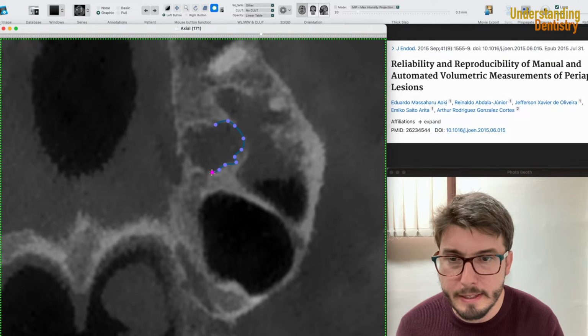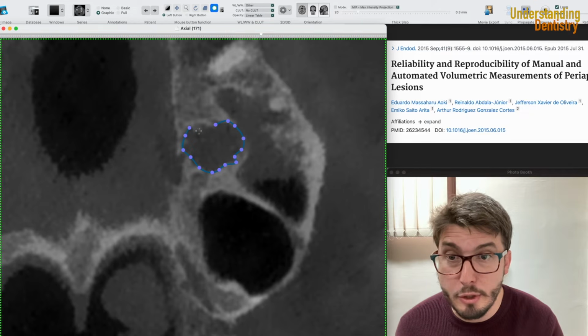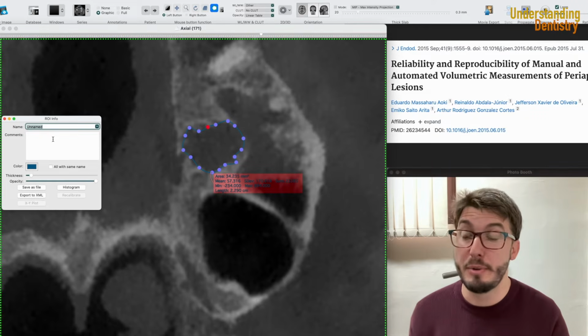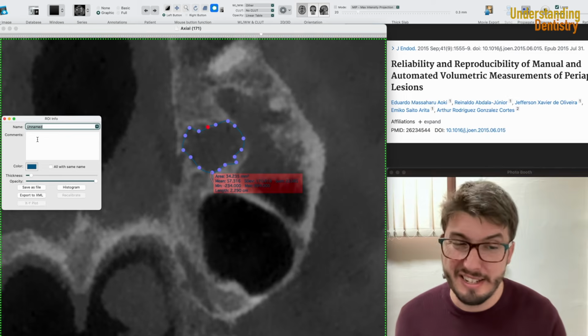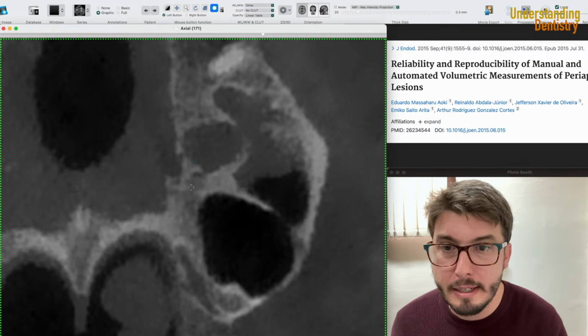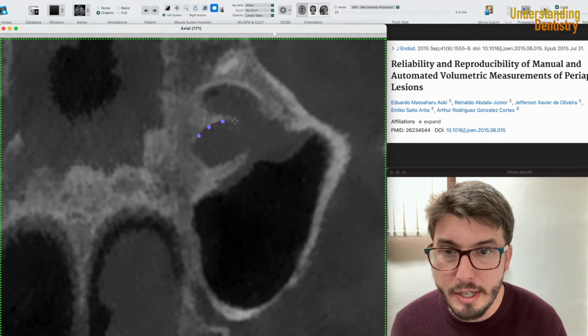All right, and then if you do more zoom and if you have a very nice CBCT device, then your resolution would be even better. That's not maybe the best device, the best resolution, because the field of view was not so small. It was actually a large scan, and then it's a little bit more challenging to do that. All right, and then let's go now. We have now this situation over here.